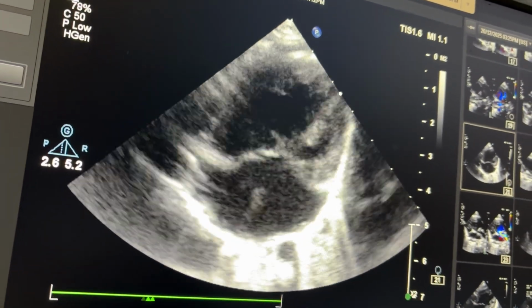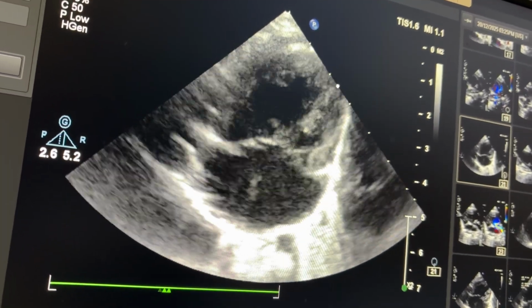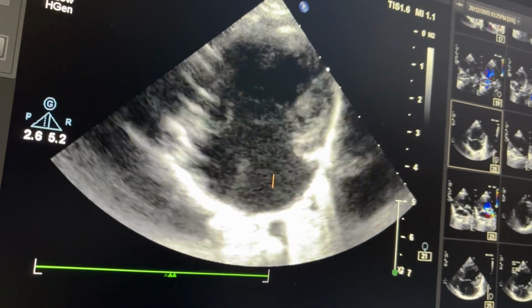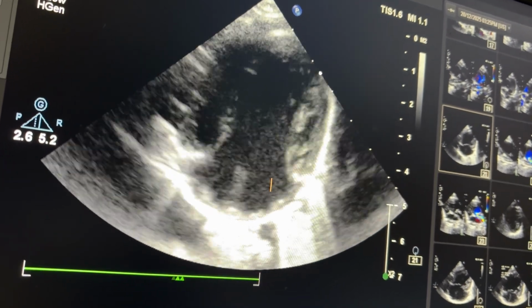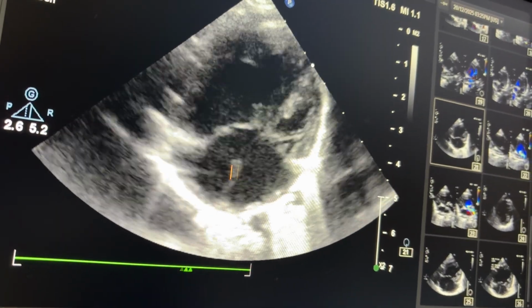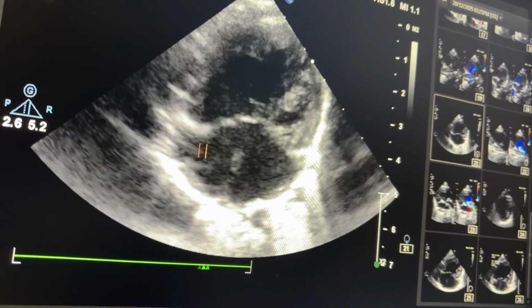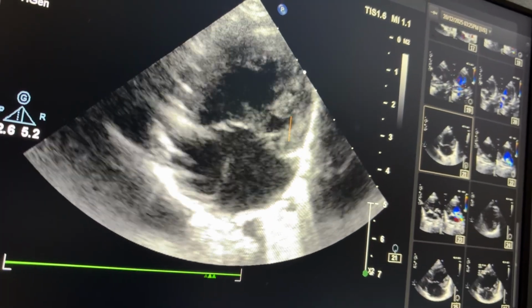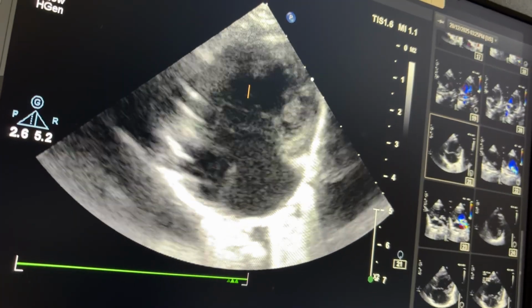One very important question is how to identify ventricle morphology. This is the right atrium. Why? Because the IVC or hepatic vein is connected to this chamber. So this chamber is the right atrium. Obviously when this is the right atrium, then this chamber should be the left atrium. Then these are two ventricles. So right atrium to right ventricle, left atrium to left ventricle.